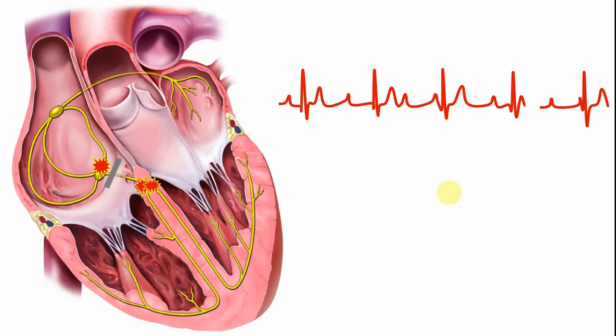Yeah, so that's a very simple animation. The real complete heart block is much more complicated. There are a lot of fine details about it, but to understand the very basic complete heart block, that's the best animation that I could get. Now, every time you look at the ECG, please go through this in a very systematic way so that you don't miss anything, because complete heart block can be missed quite easily.